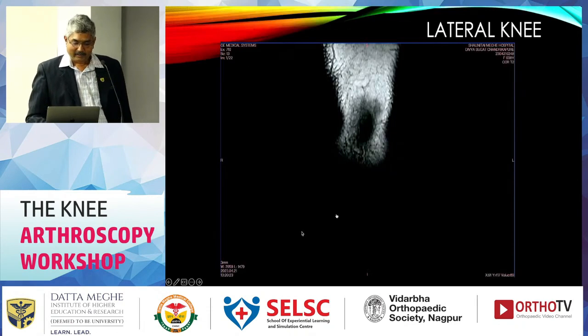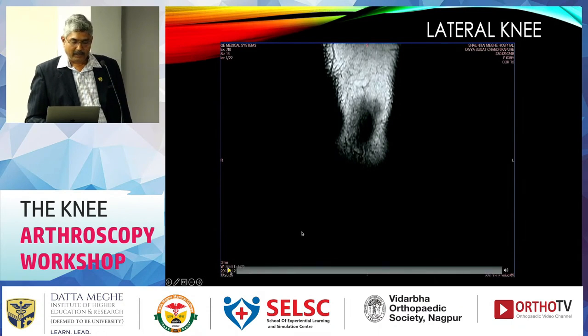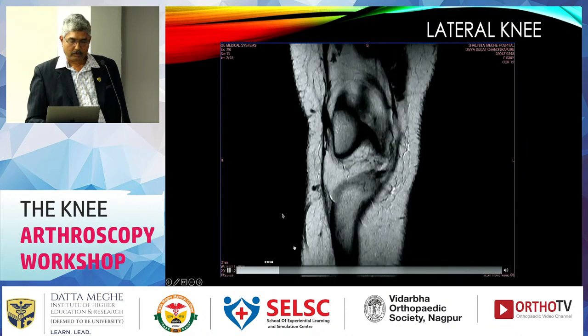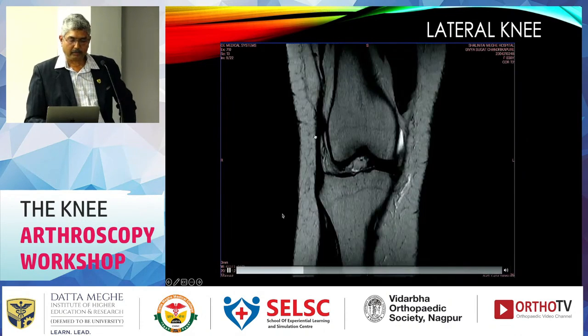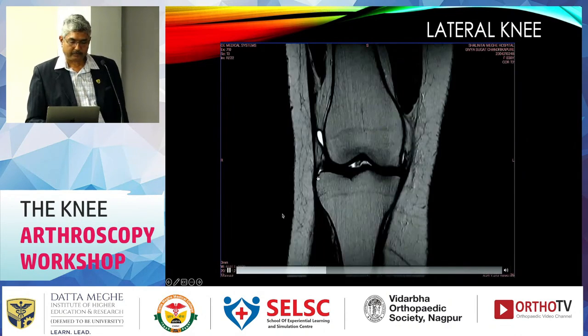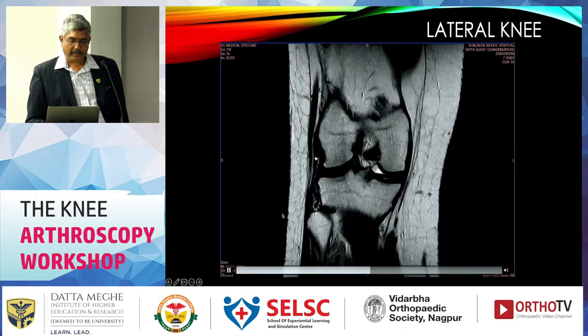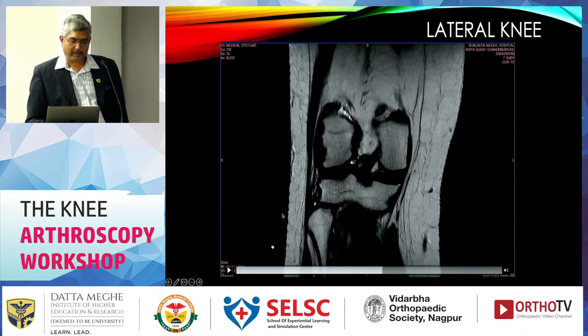So here is another video showing the same without any labels. I will try to show you, starting from the anterior part. We have the iliotibial tract. This one is the fibular collateral ligament. That thick part was the fibular collateral ligament. Here is the tibial and the medial.